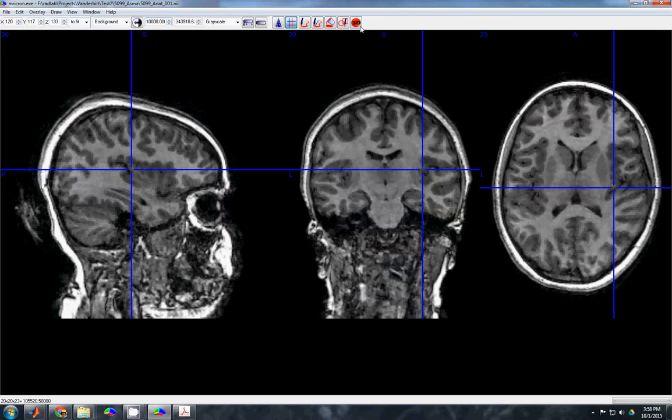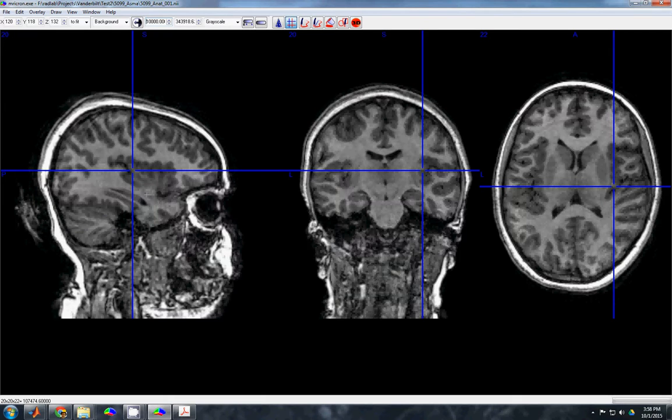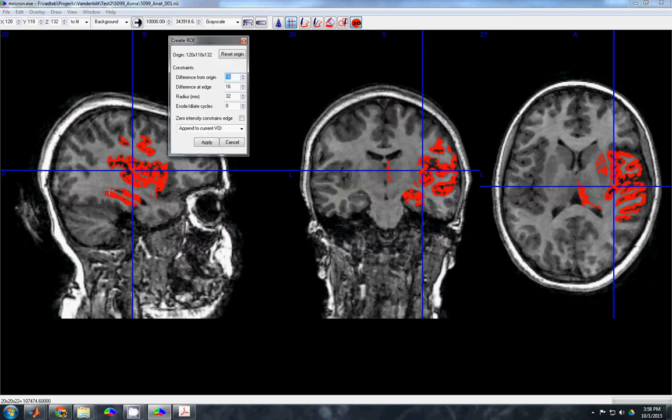Now we're going to try to inflate a 3D image so that we can get as much of the long gyrus covered as we can. Okay, so I'm going to pick a bit of the gray matter, so not right on the white matter, but the gray matter surrounding it, so the slightly darker gray stuff. I'm going to let it inflate, and you can see, oh, it's this really big sphere, and there's actually a few options that pop up here.